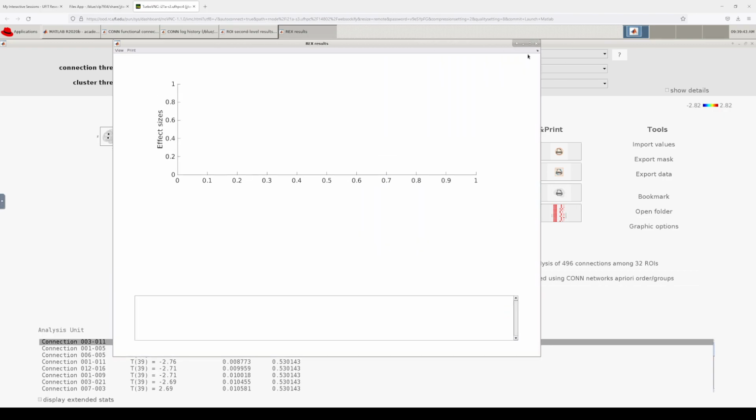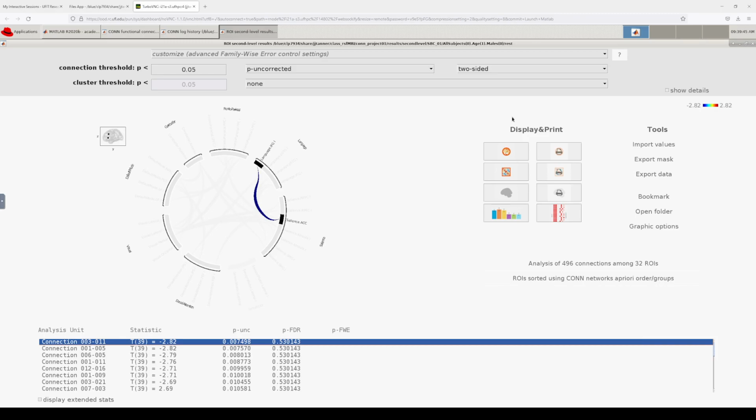I don't know if that's going to show anything. Anyway, so we'll ignore that. We don't have enough signal for this to really show, but you can look at some of these graphs. There's things you can click around on. But again, we can look at some patterns there.